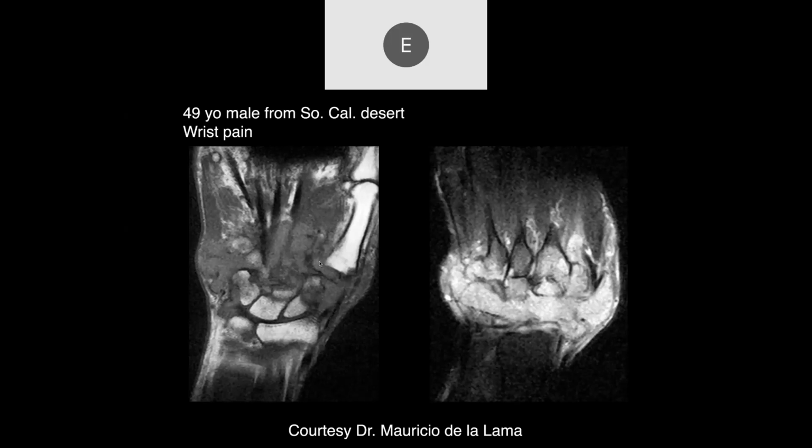There are a bunch of them, but they tend to be less symptomatic, more chronic disease where you can get a lot more destruction because they're not nearly as painful. Typically you don't get a lot of redness or even fevers with these unless they're more systemic, which they can be, obviously.